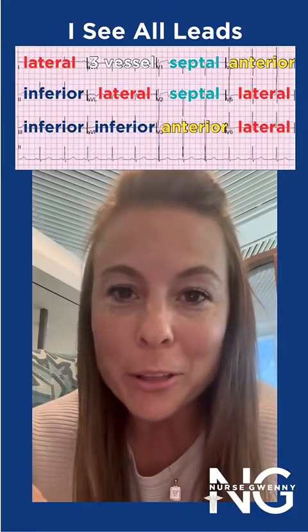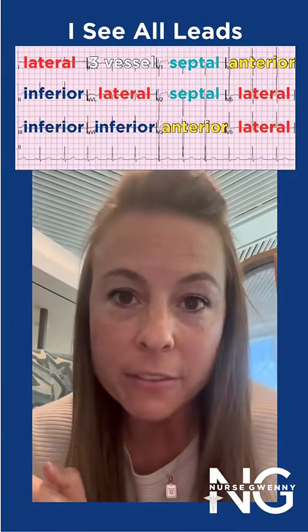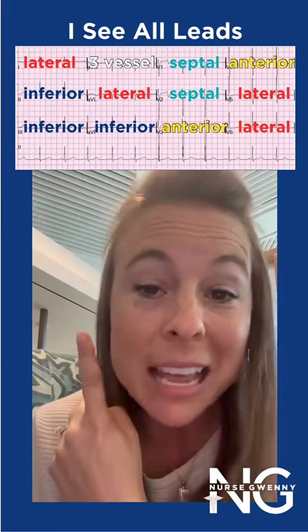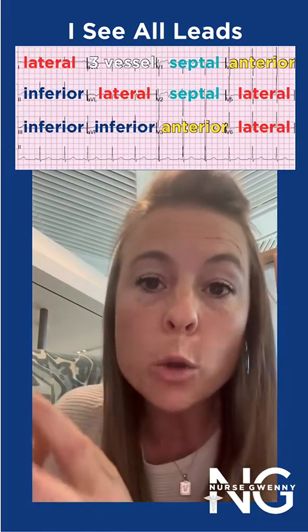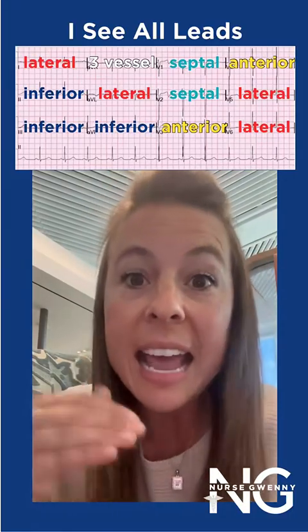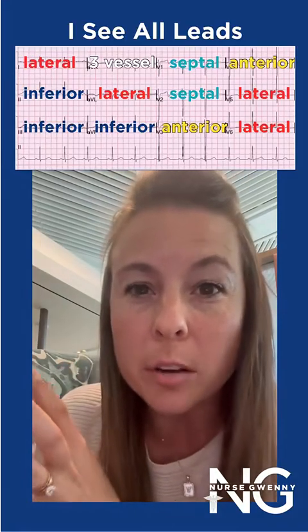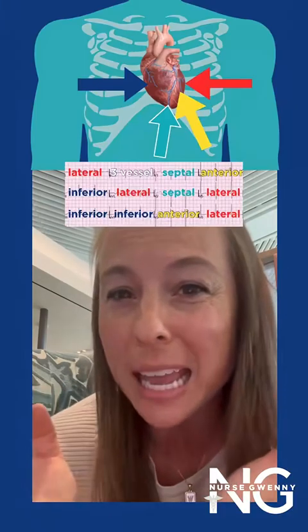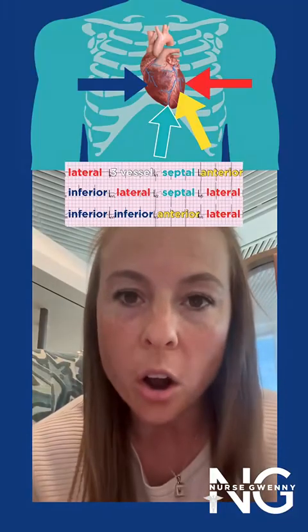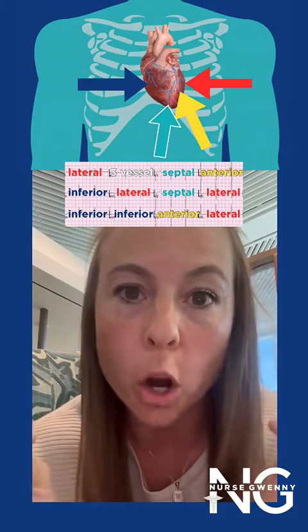So now that we understand all of those bits and pieces, we can look at an EKG and see where we have ST segment elevation, and then safely guess what part of the heart is affected. If you look at this EKG here, I labeled which leads equate to which part of the heart. I like to use the mnemonic "I see all leads," so ISAL, to help me remember. But you don't have to memorize this, because if you understand what part of the heart you're looking at based on what leads you're in, you can guess what part of the heart is being affected by this infarction, or this starvation of oxygen to that part of the myocardium.